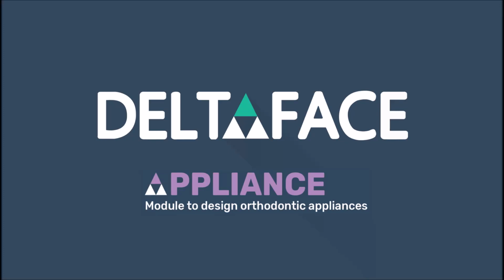The purpose of this video is to show you the possibilities offered by the Deltaface Appliance software. As an example, I will show you today how to create a lingual arch. Please note that I am neither an orthodontist nor a dental technician, and you will see how easy it is to use it.